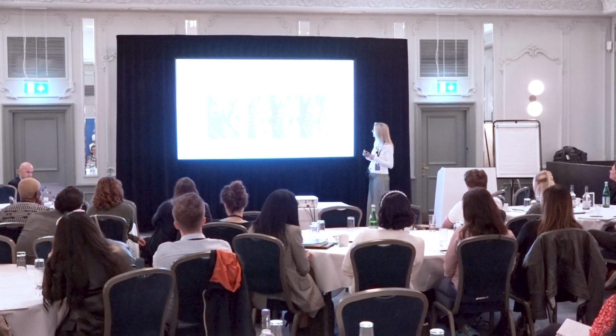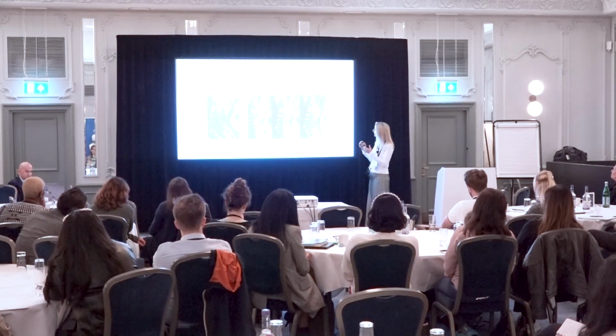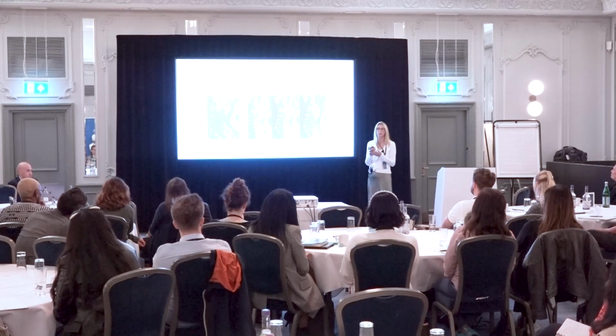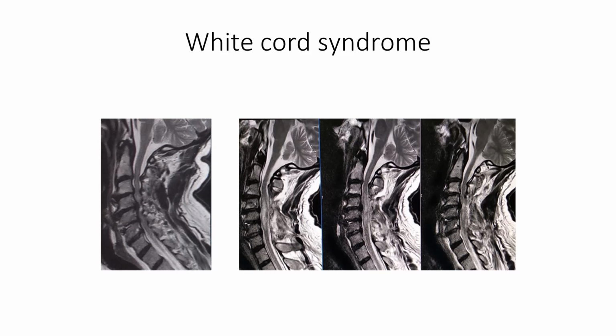One of the distressing conditions after surgery: the surgeon does a great job. They've put in the spacers, they've decompressed the spine, but the patient wakes up with profound myelopathy. And every now and then we get what we call the white cord syndrome. So this is before surgery. You can see a very degenerative spine. The spinal cord is compressed and you've got myelomalacia. Myelomalacia is the term that you've got mature damage to the cord substance, and they present with myelopathy.